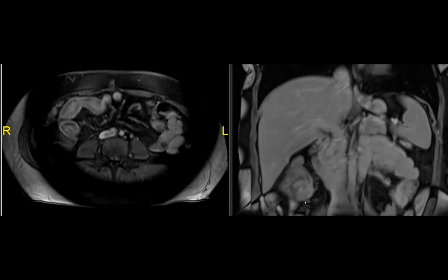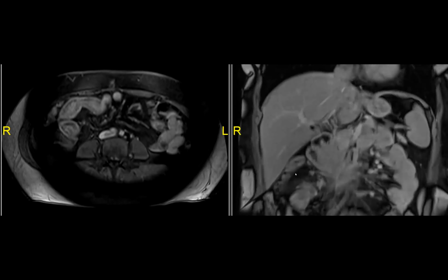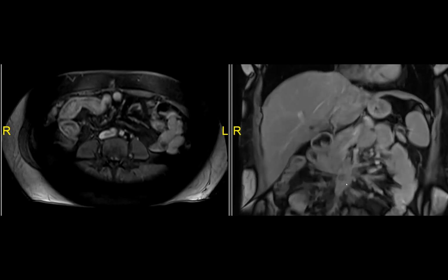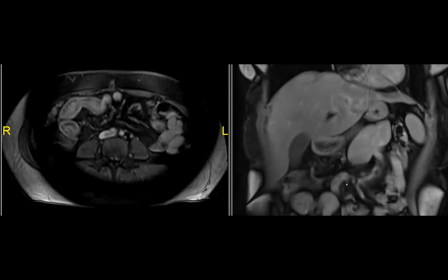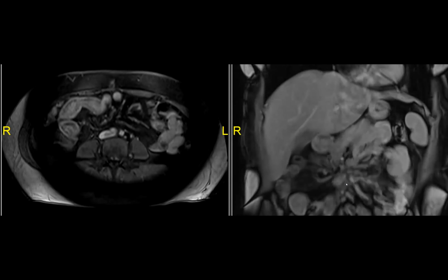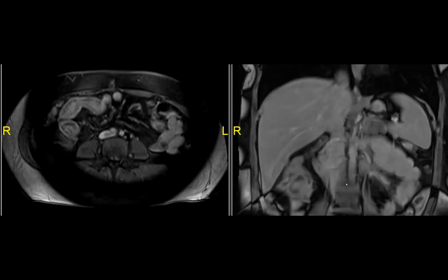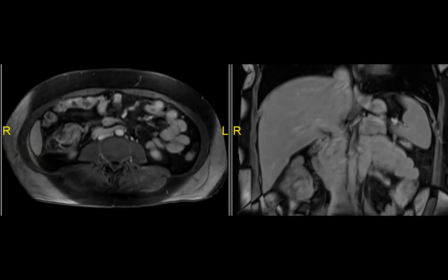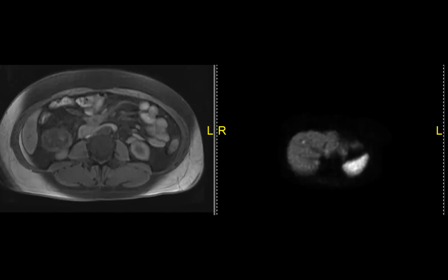Anyway, TI is a difficult call to make. I'm not going to lie. On that left-hand image, you can see all the edema too in that loop on the left side image, the axial image. Yeah, which is good for neuroendocrine also, because even if it's not the primary mass, a lot of times there's edema of the loop because of the veins being taken out, but also the serotonin being secreted in that region. So that loop does look suspicious also for neuroendocrine.